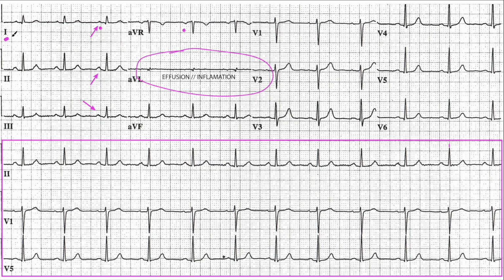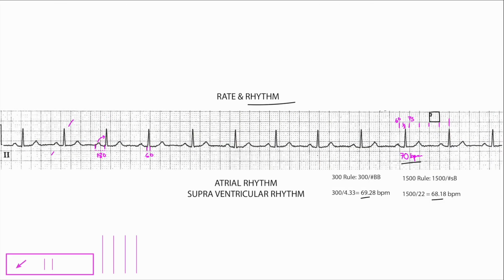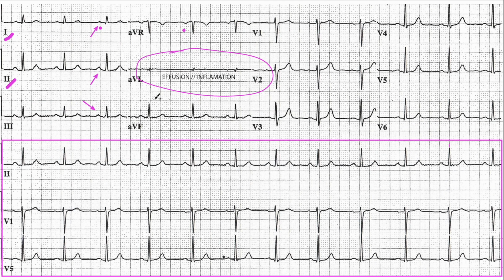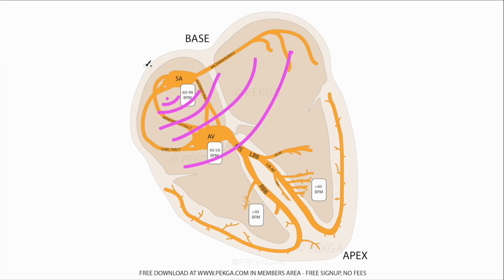Okay, so far we've covered the axis. We've gone into some analytical detail. Yeah, we did talk about this being almost a first-degree AV block. Now, let me discuss that briefly. So first-degree AV block is kind of a tricky beast. But if your patient is under the age of 50, take great care with first-degree AV blocks. They are typically indicative of something far more sinister.